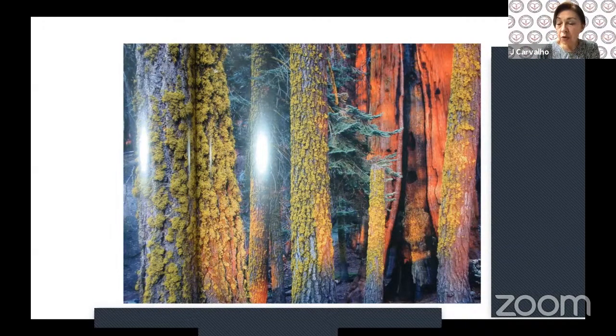But if you're not using it at screening level, I think it should be encouraged. If you are an obstetrician moving to cardiology, just be aware that the settings are different and know how to interpret the color and the pulse wave Doppler as well. And know your machine, because the machines do have slightly different names they give for the same controls.